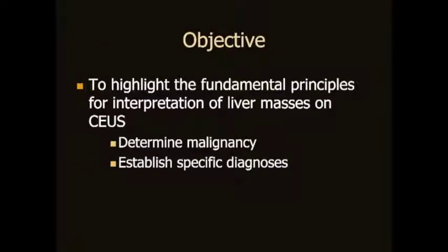So the objective of this talk is going to be to highlight the fundamental principles for interpretation of liver masses on CEUS. And we're trying to, first of all, determine which masses are malignant, and then to establish their specific diagnoses. So this presentation is very basic, but I selected it because of the timing at the SRU when microbubbles have been approved for just over a year.